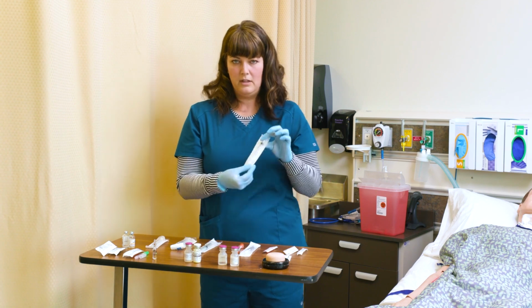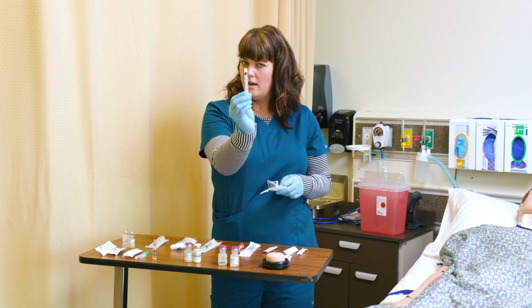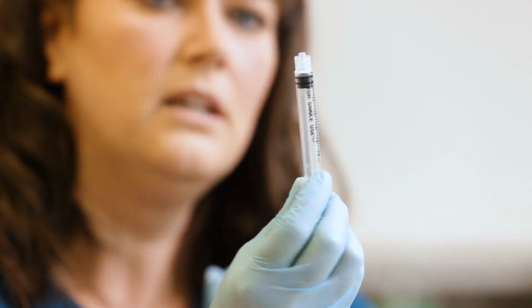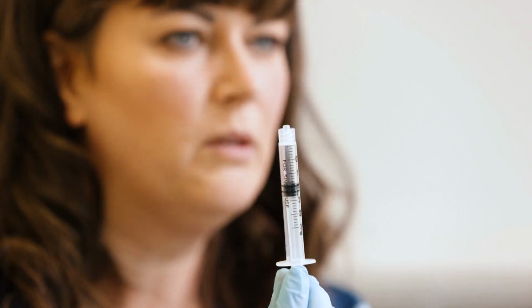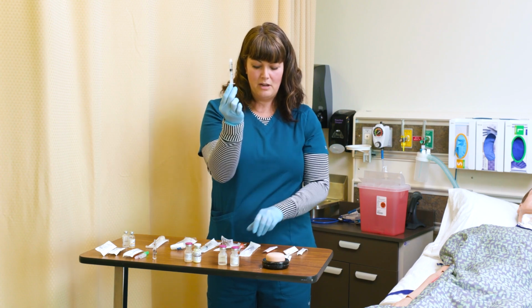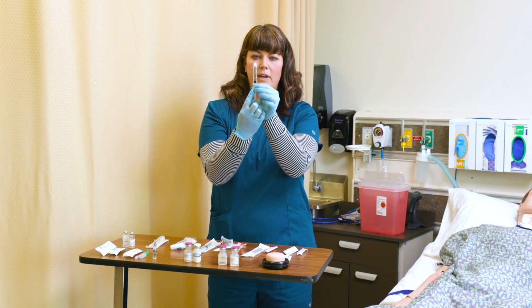Now we can go up to a 3 milliliter syringe. On this syringe, you can see those 0.1, 0.2s are not visible. You will see a 0.5 milliliter, a 1 milliliter. These go by 0.5 or half milliliter increments. You can still measure by these smaller increments in between a smaller dose, but we need to be very careful. If I'm giving 0.6 milliliters of fluid, I don't want to choose this syringe. I may want to choose a smaller syringe so I can make sure to get that exact dose. And we go up all the way to 3 milliliters.